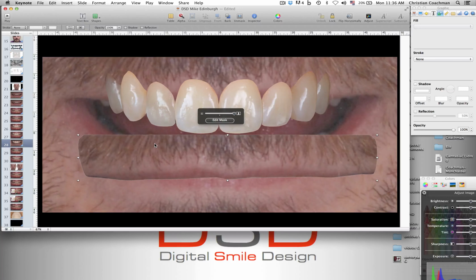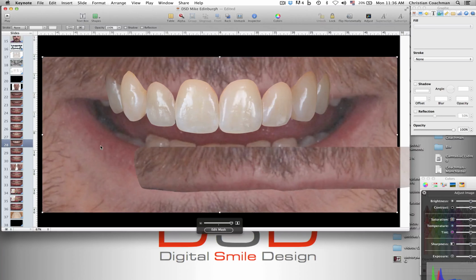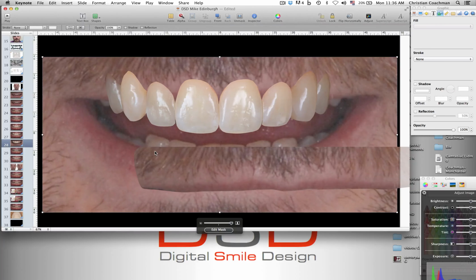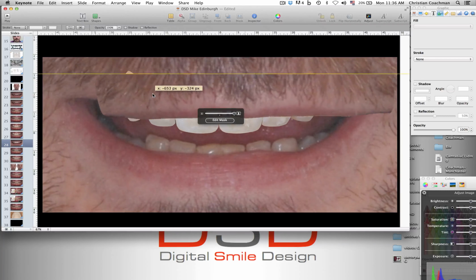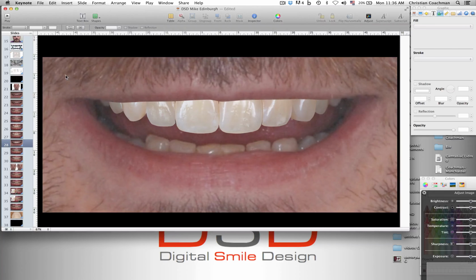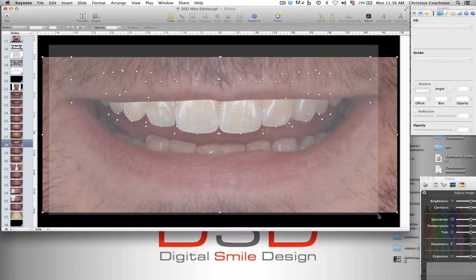That's what I can't quite get my head around. What is on top of what? So that's the bit you've cut. You have here the picture: picture, teeth, lip, and the lip. Right. Okay. So because this lip is perfectly overlapped, you don't see there's two pictures. Yes. Okay. So now the thing that you want to do is to zoom out to see the patient's face.